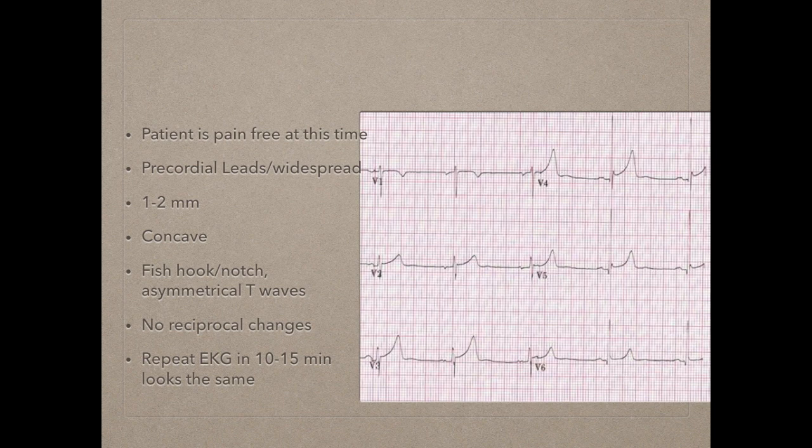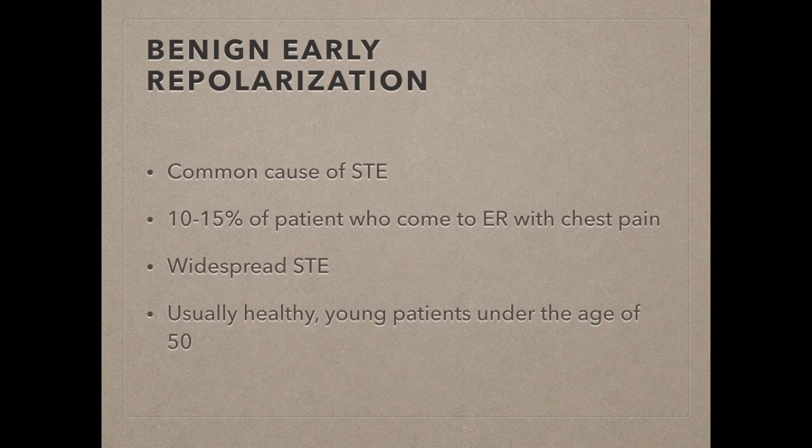The good news is we didn't have any reciprocal changes on the EKG. There was no sign of ST depression anywhere. And with this guy, when we repeated the EKG in 10 or 15 minutes, it looked just the same. So what do we have going on here? Well, if you haven't figured it out already, it's benign early repolarization.